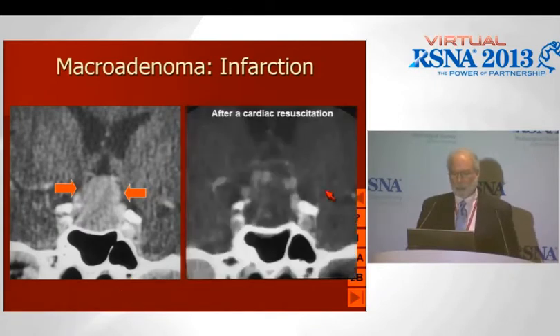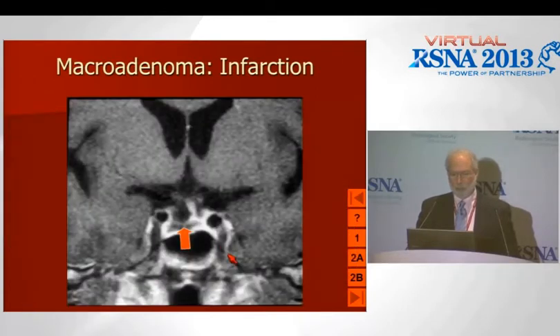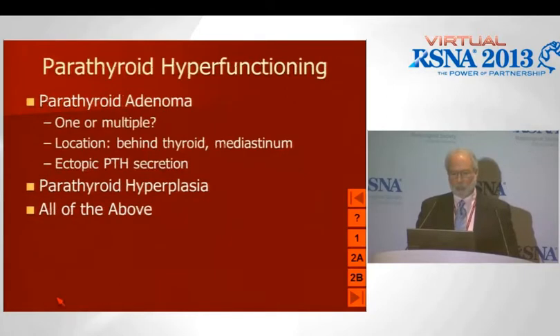This is an interesting case where the patient had a macroadenoma and then had a cardiac arrest, and they had a spontaneous infarction in the tumor there. And here's another patient who had an infarction. So let's talk about the neck for a second.